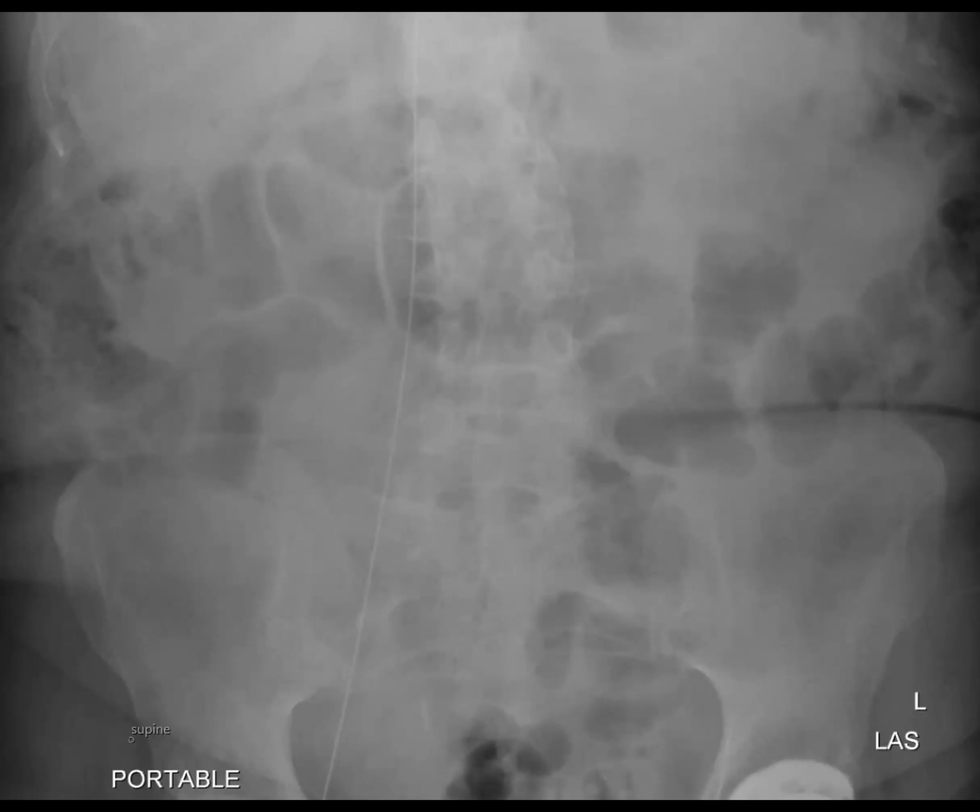Once we identified it on the MRI, creating this artifact, and saw it on the CT, they consulted IR to remove it. One small part in the pelvis was retained, probably adhered to the wall, and it broke off, so they decided to leave it rather than trying to take it out more aggressively.